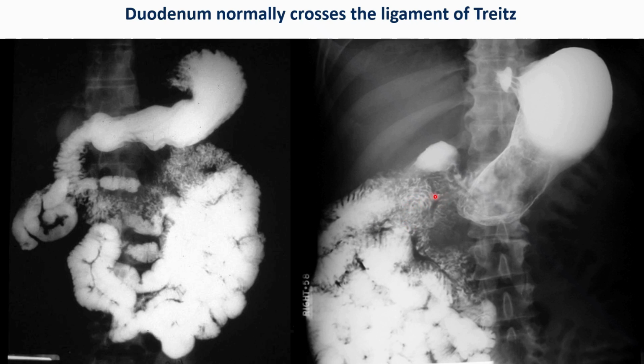But sometimes, depending on how tight the malrotation is, the Ladd bands, you can go. This was a 30-year-old we diagnosed incidentally on the CT scan, and just to confirm it, we did the fluoro study, and the contrast passed through no problem. Just realize the colon's going to be on the left side. They might have left-sided appendicitis, but otherwise this patient was asymptomatic.